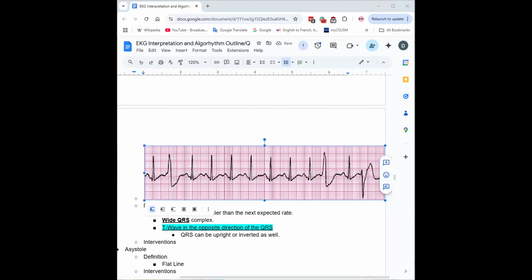There's ventricular bigemini, trigemini, quadrigemini, which is essentially how often it's happening. You don't need to know it, but if you for some reason want to know it, the only thing I think is good to know about the PVC that's not already been mentioned is that it can turn into VTAC.